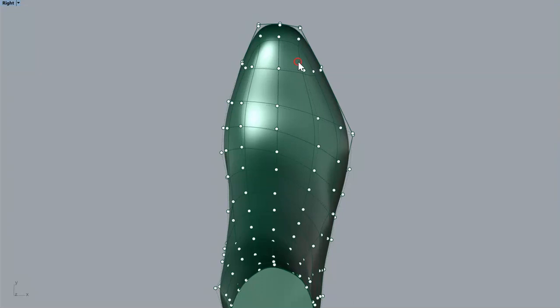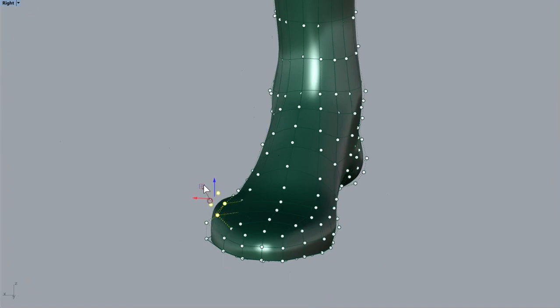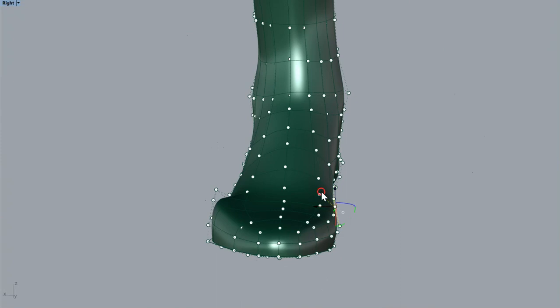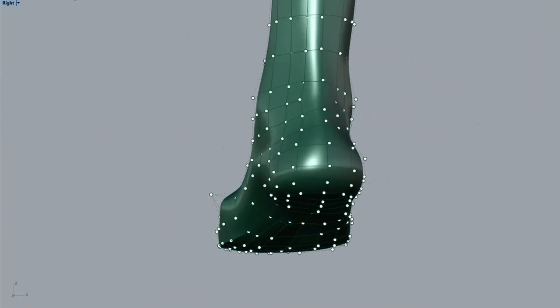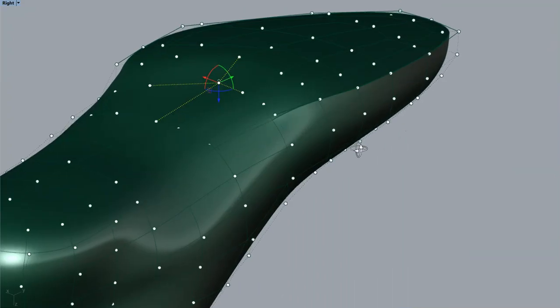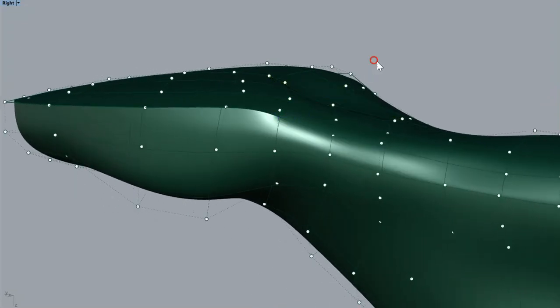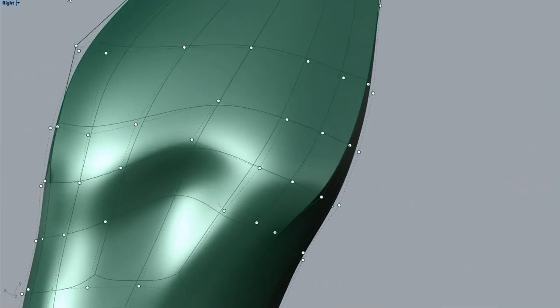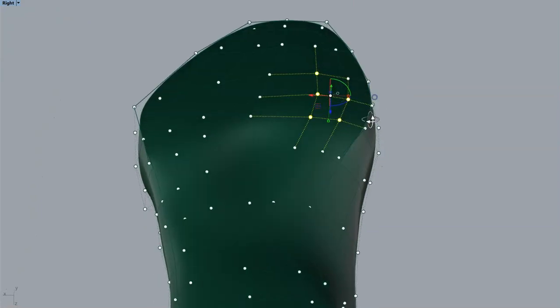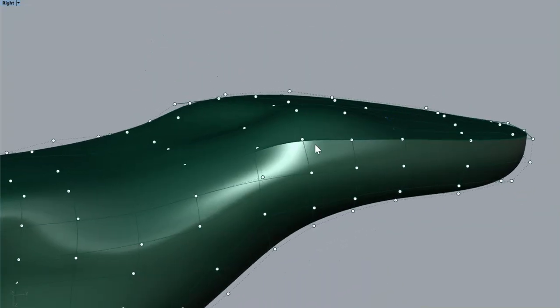Extra room for the fifth toe, or if you have a hammer toe here, you can make it higher, or you have a bunion. Anything you want. You want to relieve pressure on the metatarsal heads, you can have more support here. I already modeled some support inside this one. You see this cavity. I want some more depth for the first metatarsal head. Now I can play around with it. There are other things.